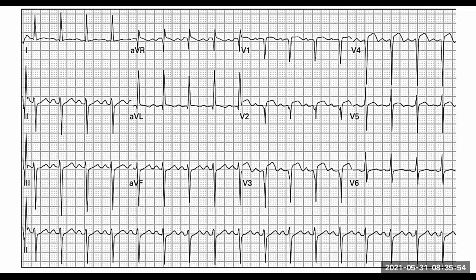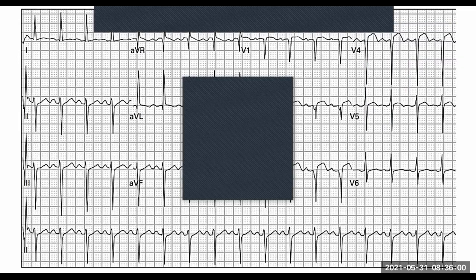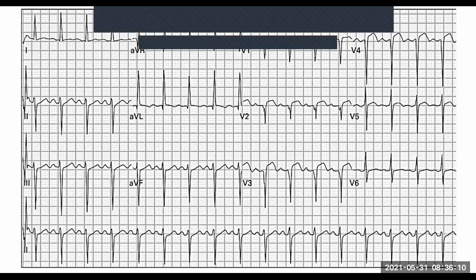So in this one, for example, let's draw a line. Oh, sorry, somebody's been chatting. I didn't see. Thank you. Was that inversion? Sorry about that. I didn't see that. Just annotate this a little bit. All right. So let's draw this. Okay. So let's start a line from there. You can do this with your pen, wherever you want. Let's go across there. Right. So that's our ST baseline.